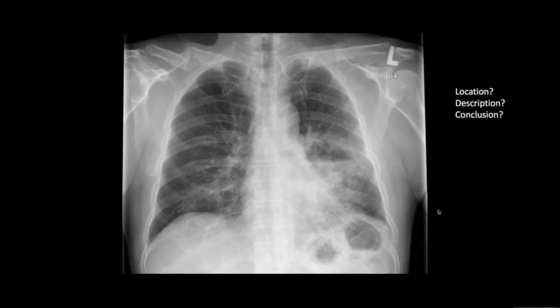Infection includes pyogenic lung abscess and tuberculosis. Primary lung malignancy that tends to cavitate is squamous cell carcinoma. Now, the presence of an air fluid level and surrounding consolidation points towards infection. And obviously, this has to be correlated clinically to see if there's any clinical sign of fever and biochemistry showing elevation of inflammatory markers.